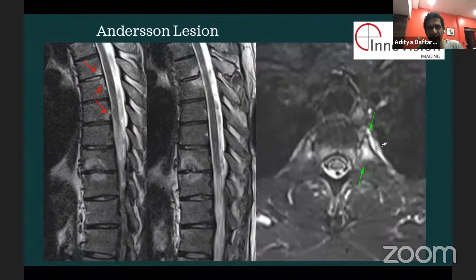And when you look very carefully at the axial STIR images, sometimes you'll see costotransverse osteoarthritis or costotransverse arthritis, or costovertebral arthritis, which is essentially an Aunt Minnie or a gimme, a complete pathognomonic finding for an inflammatory arthropathy. So this is something that you should look for.